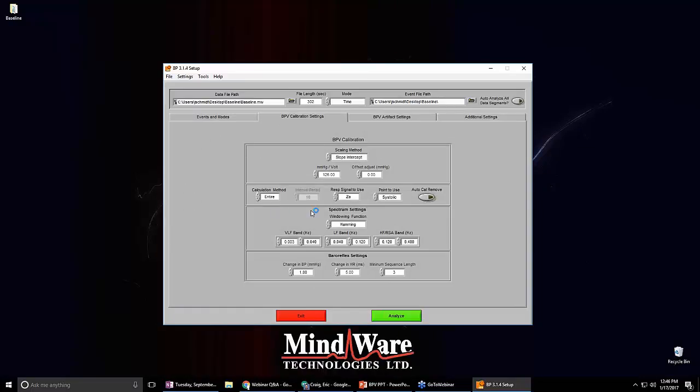Just takes off everything. Respiration signal that we're using: as I said when we were mapping the channels, we're going to use the Z-Naught. If you had a respiration belt that was also within the data set, you could select it from there. It's grayed out because I don't have one. Or we could use the DZDT, but we would definitely recommend pulling our respiration from the Z-Naught in this case.